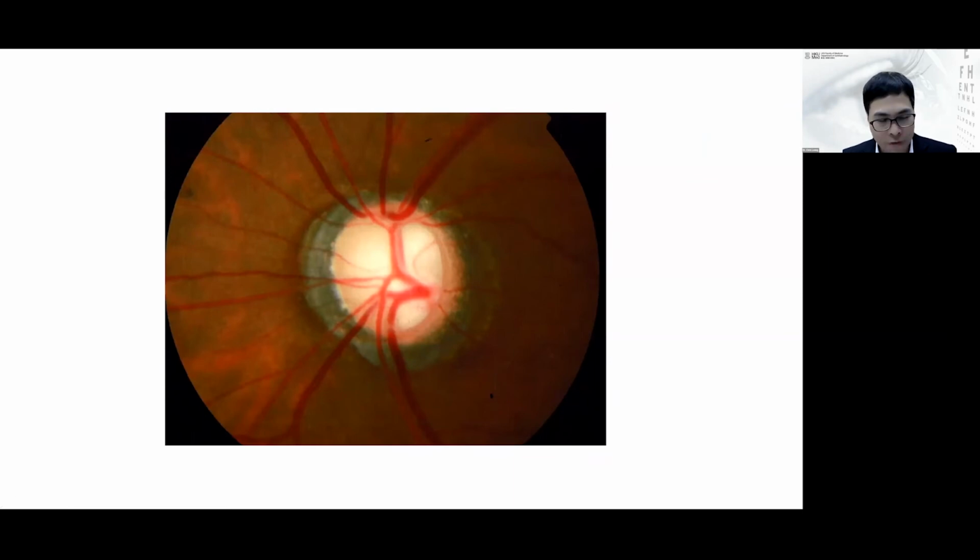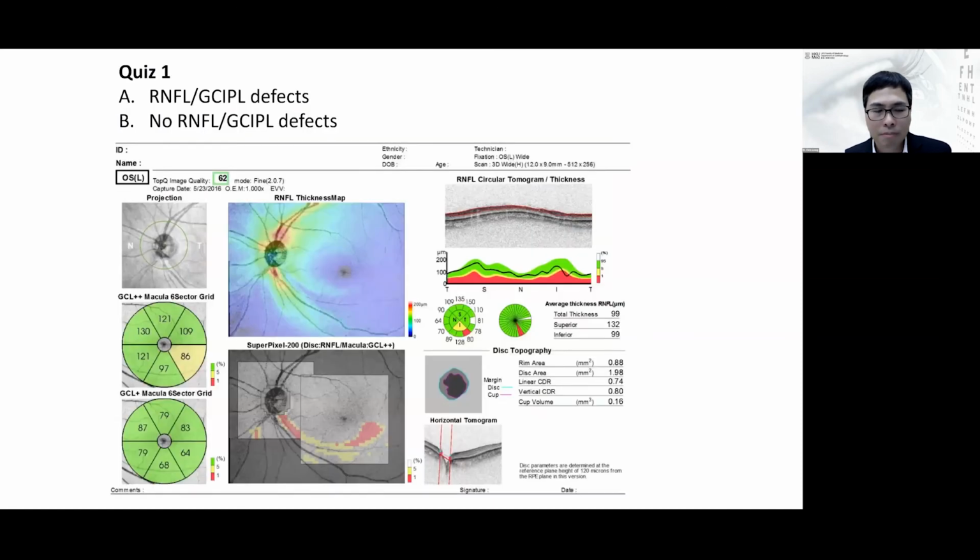Glaucoma is actually the most common form of optic neuropathy. It's characterized by cupping, loss of the rim, and loss of retinal nerve fiber layer, but look at the residual rim in this advanced glaucomatous eye: it remains pink. That's why studying the rim color is important. The disc looks pale because the rim is very thin, but the residual rim remains pink.